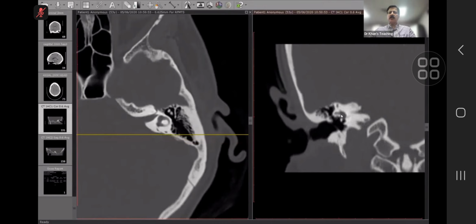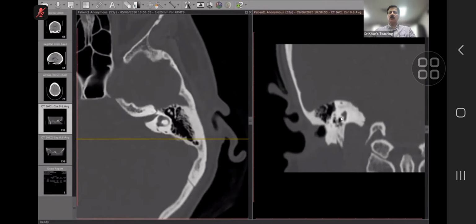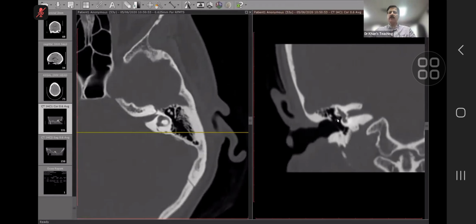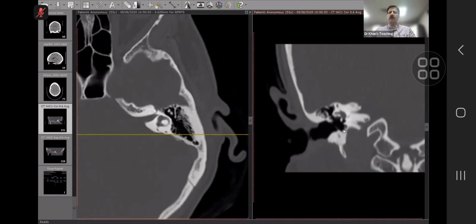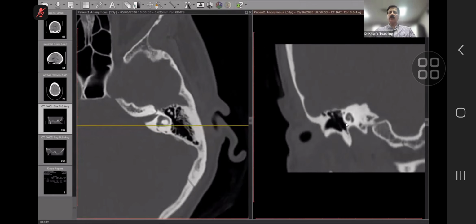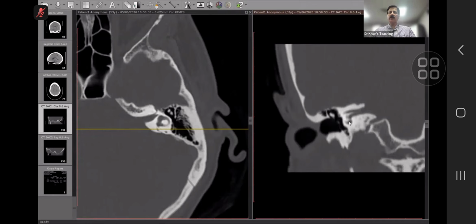And we can see that this is the lateral semicircular canal. And this was the scutum. So superior to the scutum, this is the epitympanum. From here till here is the mesotympanum. Hypotympanum is not important. This bulge here is made by the cochlea, which is this thing, cochlea.